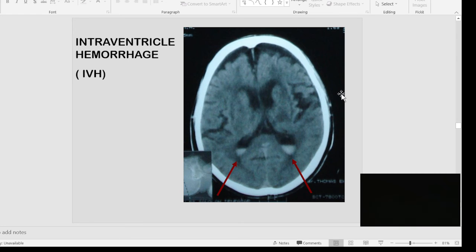On the other side, it is not yet, no, very disturbed, but very distorted na yung appearance. Look at that. So na siyang hemorrhage diri sa sulod. Intraventricular hemorrhage. But kasabot nga nung nagka-hemorrhage dira, it might be because na trauma ang brain. Look at this.